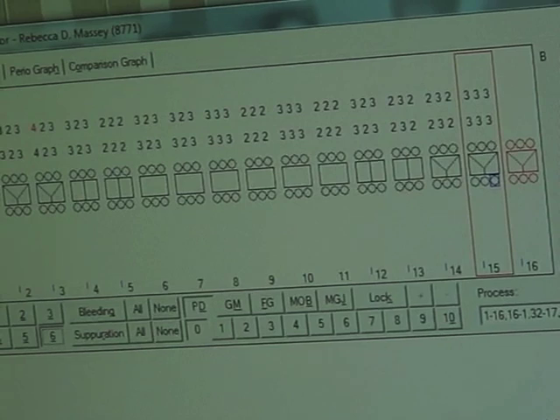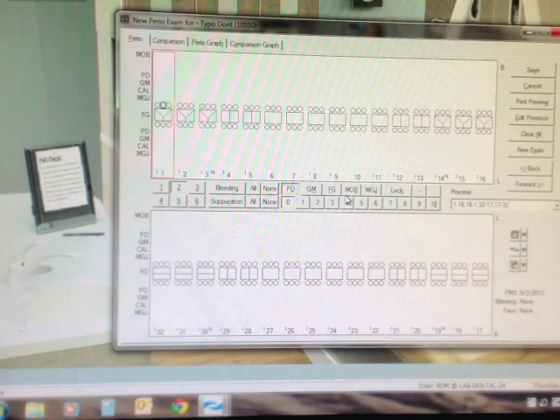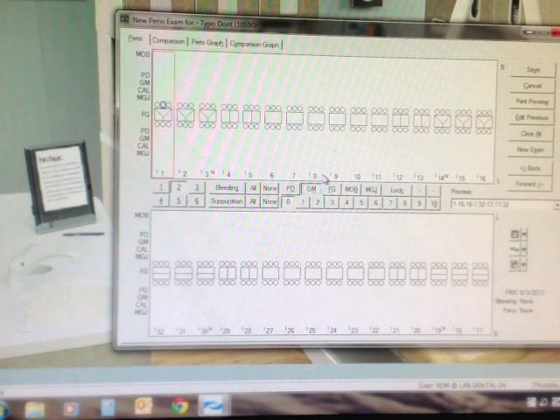It will automatically go to the lingual side after you are done charting the buccal surfaces. After charting the pocket depth measurements, you are able to move on to the gingival margin. Click the GM button and select where there is recession on each tooth that presents with it. For example, tooth number 1 has recession of 5 millimeters.